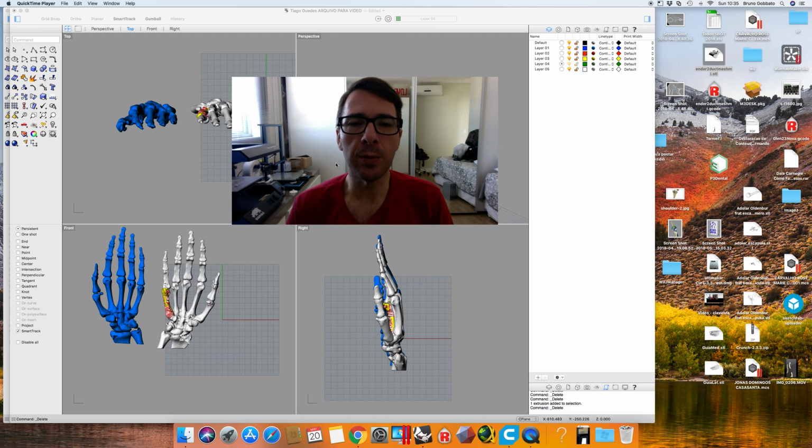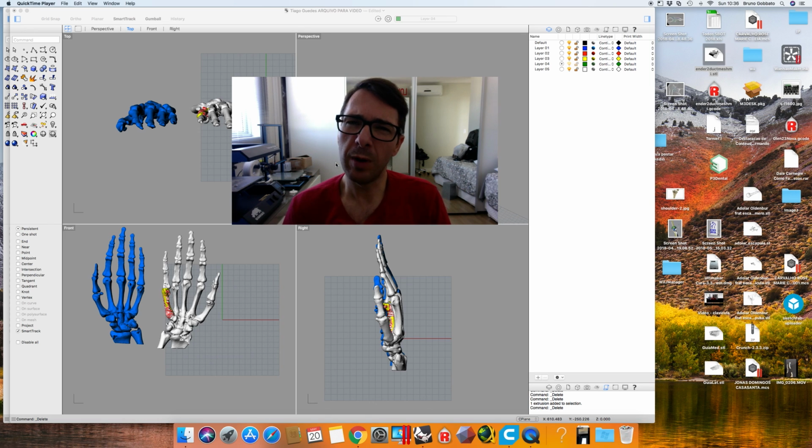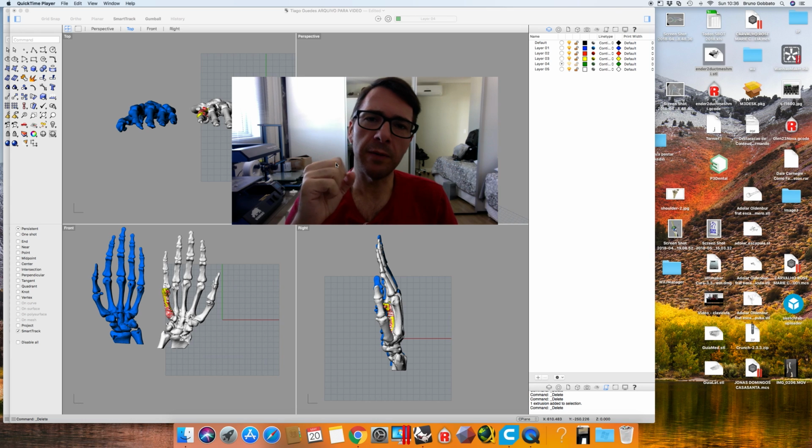I'm not very into hand deformities, but a patient of mine, knowing that I work with 3D, asked me if I could help him, and so I'm going to help. I'm going to try measuring some deformities of his hand, and I'm going to show you guys in real time how I do this. For a start, this patient had a fifth metacarpal bone fracture. I think it's one or 2 years now, and he has a rotational deformity of the fifth finger. Oh, sorry, and he complains about mild pain and some strength deficit.